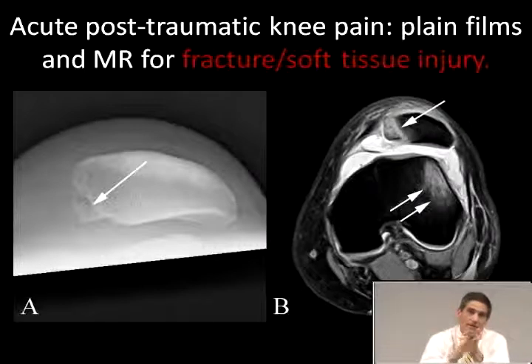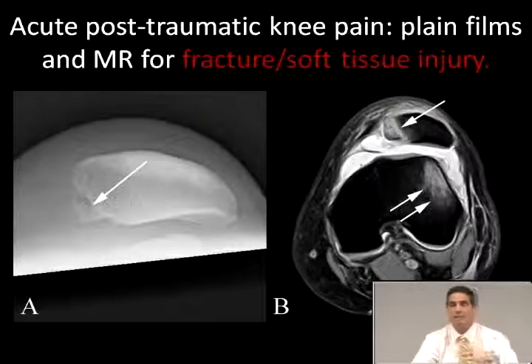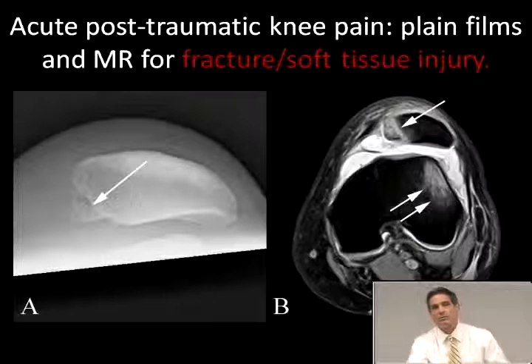These are usually relocated by the time they come in, but can result in contusions of the medial patella and lateral femoral condyle, medial retinacular tears, and joint effusions. Sometimes fragments in the joint which are loose, which need to be located and removed for good results.